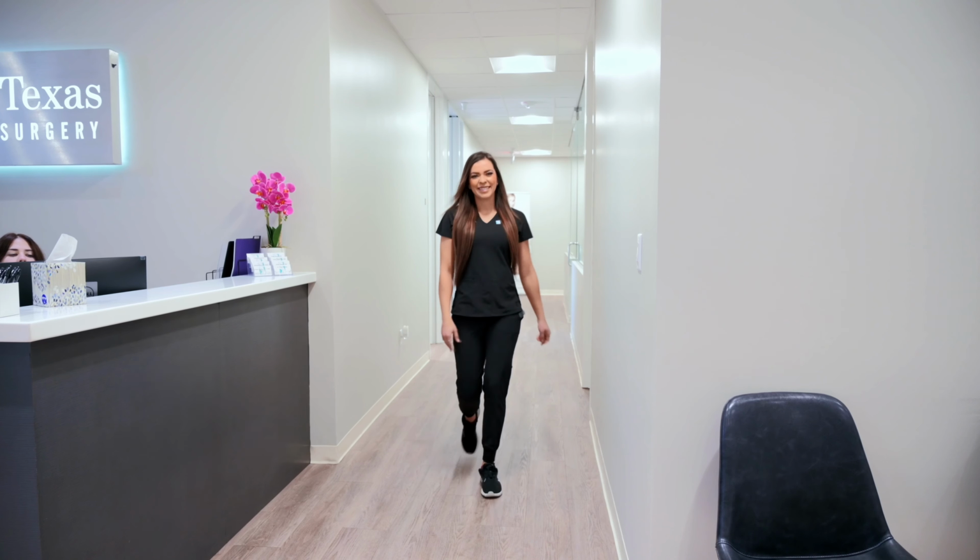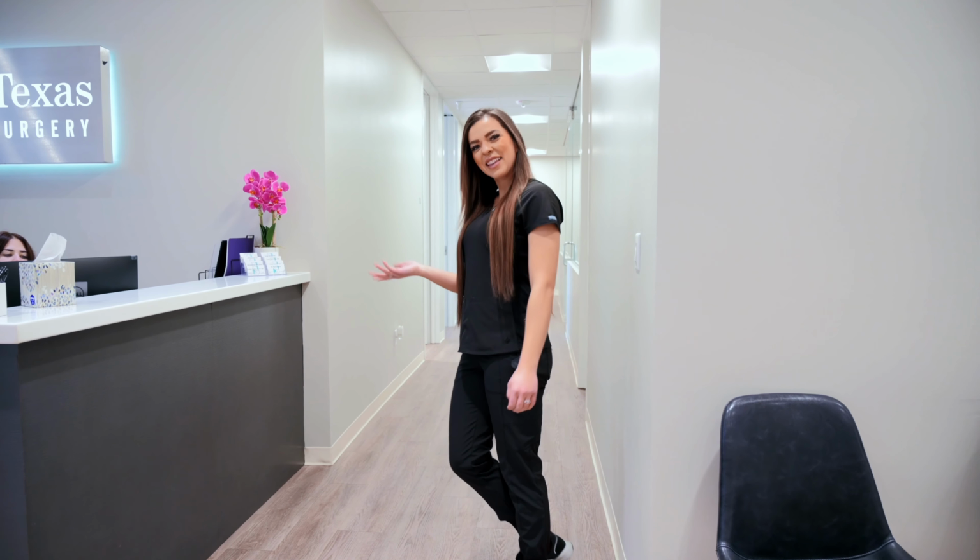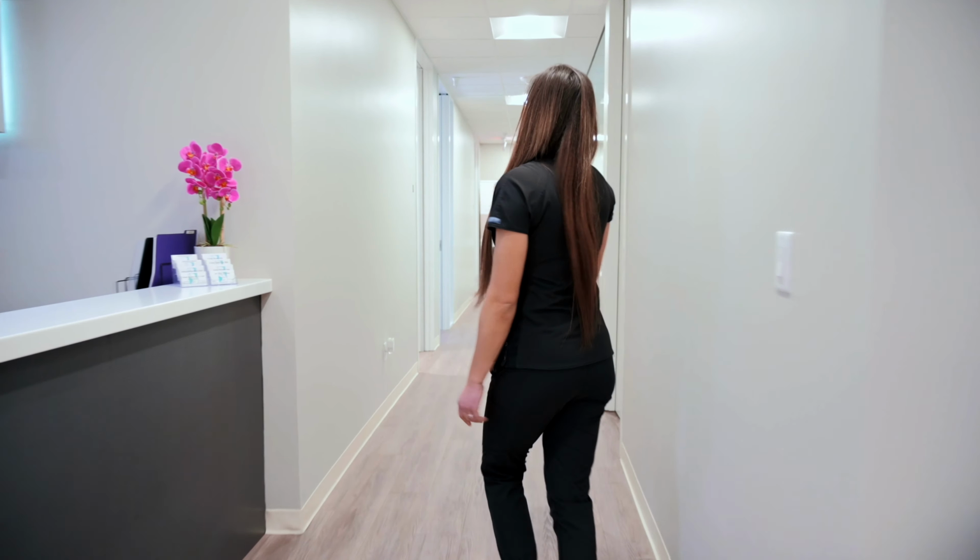So one of the ways that we're going to help with this is when you come in for your consultation, you're going to start with chatting with my nurse, which is just a little bit easier because she's a little more disarming and sweet than I am, and will help guide you. So what we'll do is we'll put you in a sports bra, and then we have sizing implants to try.